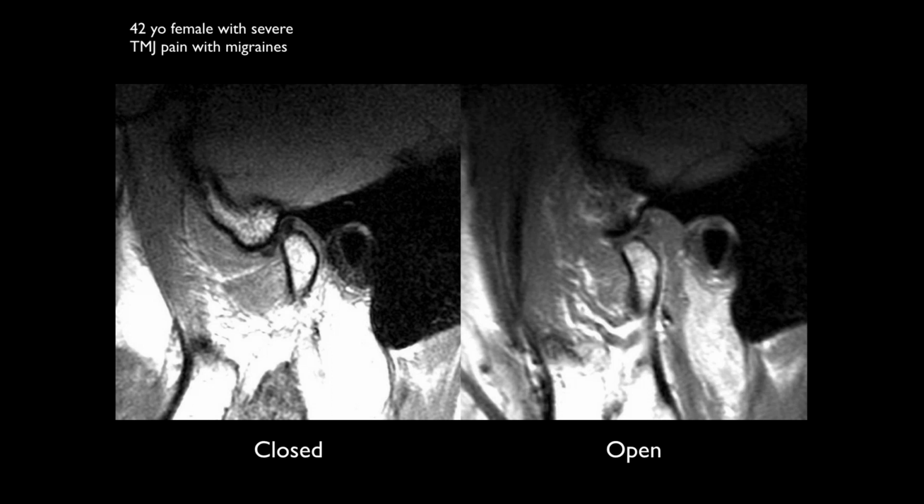Okay. And what about the open mouth view? Open mouth view also. Okay, it's thin. I don't know. The disc is, see, there's a little bit more increased signal intensity within it, but the margins are fairly sharply defined. And what happens often is when you get pressure on the disc, the margins are less well visualized, and so this is pretty common, which we see there.